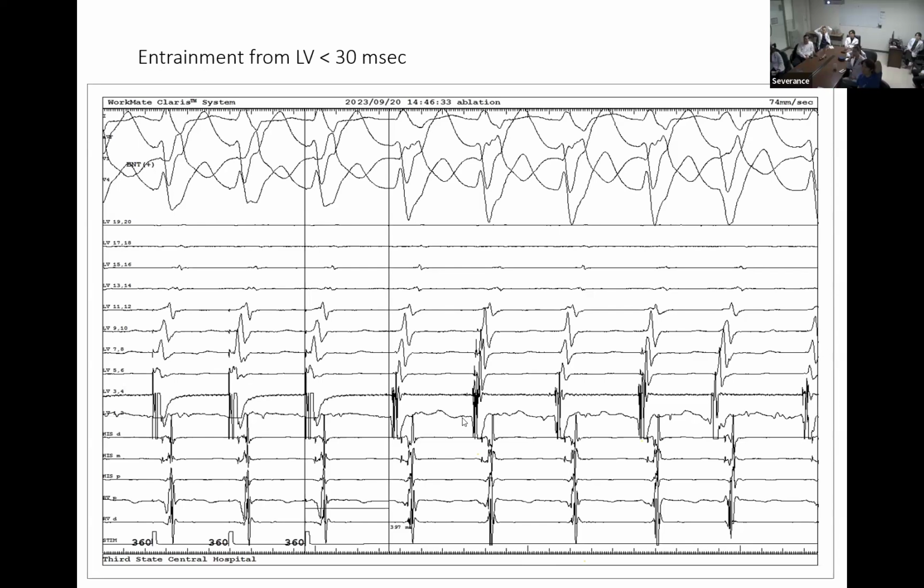It is important to memorize the His bundle potential in normal sinus rhythm. That would be a landmark for the conduction system potential. So you guys need to keep looking at signals and memorize those signal images. It's important. Short, very sharp, and very high frequency content.